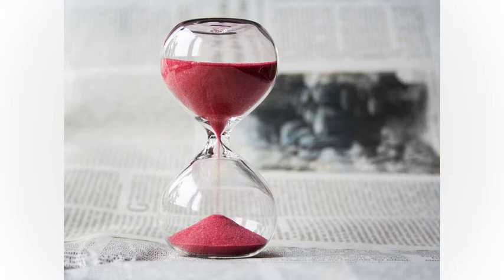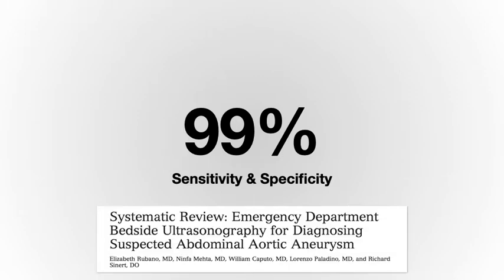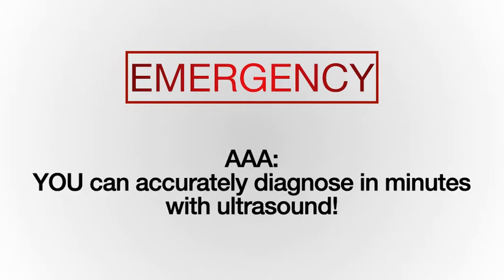So every second counts when it comes to diagnosing a ruptured AAA. Luckily, ultrasound can help us rapidly diagnose an abdominal aortic aneurysm at the patient's bedside. But just how good is ultrasound? Well, remember this number, 99%. That's the sensitivity and specificity of ultrasound for diagnosing AAA based on a 2013 systematic review of ED-performed ultrasound. So here we have a deadly disease, a true emergency, and you can accurately diagnose this disease in minutes with bedside ultrasound, which can save a life.